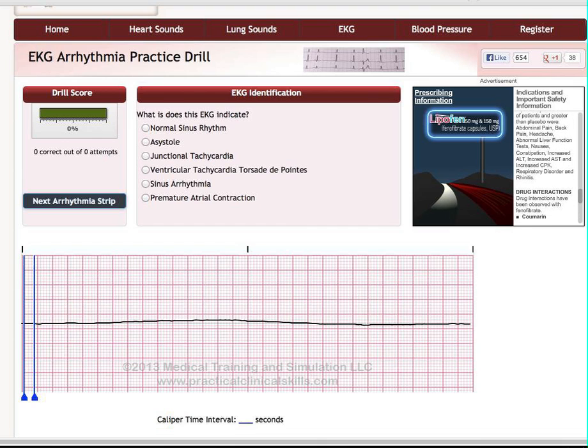I'm just going to do another EKG rhythm identification video. You guys seem to have liked that from before, so we're going to do another quick video here to go over some common rhythms that you'll see. I don't necessarily agree with all of the diagnoses that they give on here, but I think it's a pretty good foundation of the basic rhythms. So I think it'll be a benefit for all the guys out there trying to get this under their belt. So without further ado, let's start here.